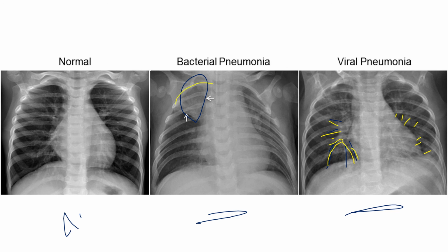And then here's your bacterial pneumonia, your right upper lobe, and this is a kid, right? And so this is just an example. Now, kids that lay on their back most of the time, so kids 6 months or less, tend to get more pneumonias and bad stuff in their apices because they're laying down more often. Us adults tend to get them in our bases. But this kid on the right, this viral pneumonia, this is also a neonate x-ray. You're seeing this viral pneumonia that's probably from RSV. If you work pediatric patients, you'll see RSV can cause this and ultimately cause RDS, which is baby ARDS.